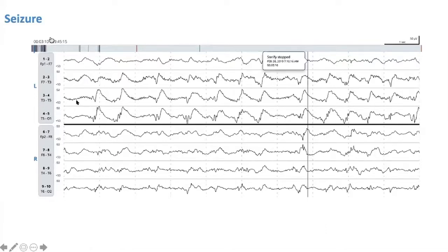John, what you mentioned, poly spikes, for the audience, you were referring to these multiple spikes followed by a slow wave, correct? Sometimes that's right. Spike followed by the slow wave. If you see only the slow wave without these, you may not perhaps worry, but having these 3 phases of one spike followed by a big slow wave, that's what you were referring to. That's right. So the canonical shape of the spike and slow wave has a variation where you have 2 spikes or 3 spikes leading into the slow wave. And it has the same clinical significance, even if the shape is a bit different.